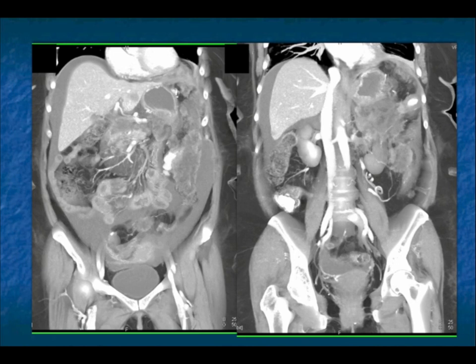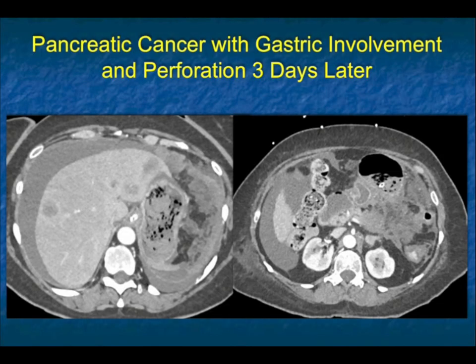And you could see when we do patients with pancreatic cancer, when we're staging or we're planning surgery, when we're dealing with the surgeons or the oncologists, we use all our tools from the axials to the coronals to the sagittals to the volume rendering to the MIP to the cinematic.